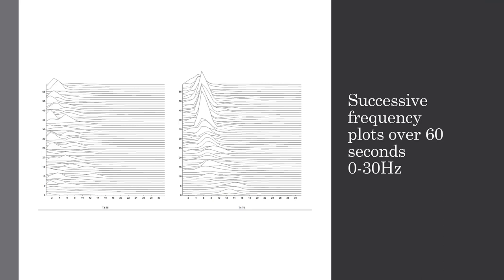If we take EEG over 90 seconds, here's the onset of the seizure in this first row of channels. We can see it from left to right in this upper third. If we go down to the middle and look left to right, we can see it gradually evolving as it goes from faster to slower. So what if we plotted out the amplitudes by frequency? This is again what we looked at in the FFT example, where we're plotting T3, T5 versus T4, T6. Frequency is left to right, and time is going backwards here. We're looking at the most recent data at the leading edge, which appears closest to us, and then those mountain ranges recede into the distance.